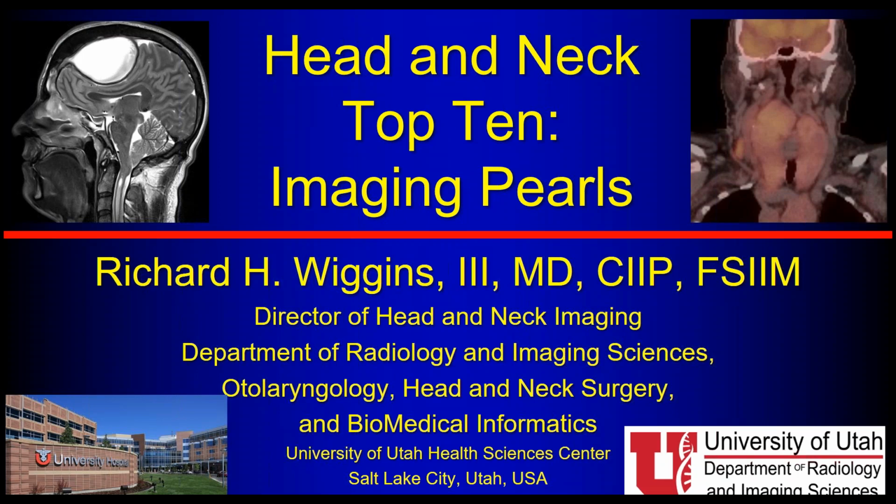But this is where the T2 is very helpful because on the T2, as a rough marker of tumor cellularity, the tumor will be dark, but the secondarily obstructed secretions in the sinuses will be bright. So I don't investigate all of the T1 hypointense lesions. I try to look at it and see if the enhancement is similar to that of the turbinates and the other mucosa. So that's what I try to do to evaluate that.